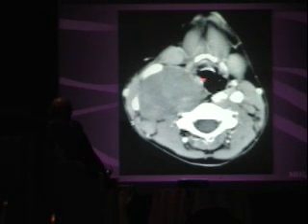So it's not really splaying them. It's not between them. It's just kind of displacing them anteriorly. So in terms of the vessels, carotid, external, internal, this is post-styloid. What was in the post-styloid parapharyngeal space?